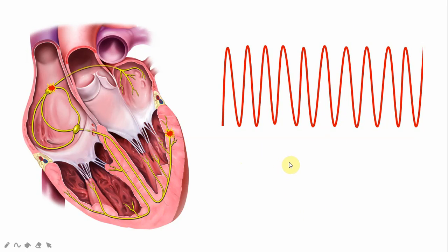If that is the case, highly likely that this is a VT. The specificity, as we have mentioned earlier, is 100%, so you can rule in VT. However, the sensitivity is not that great, which means if this pattern is absent, then we cannot say for sure that this is not VT. So you'll have to go to the next step. This particular pattern is not very common, but if you find it, you can be rest assured that highly likely this is a VT.